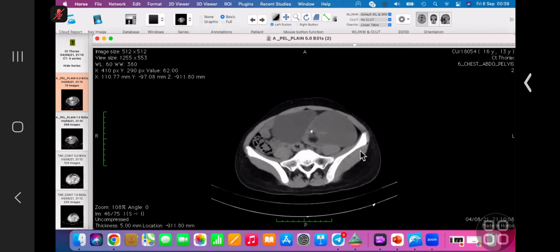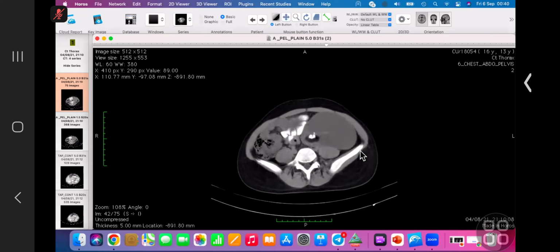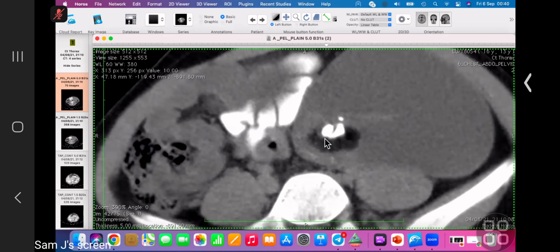Okay. How about teratoma? Yeah, it could be possible because teratoma also contains fat and calcification, yeah, it could be. Yeah. So look at the calcification. Let me take over this case. Have a look at this calcification. Is it just within the fatty component? Can you see this? Yes.